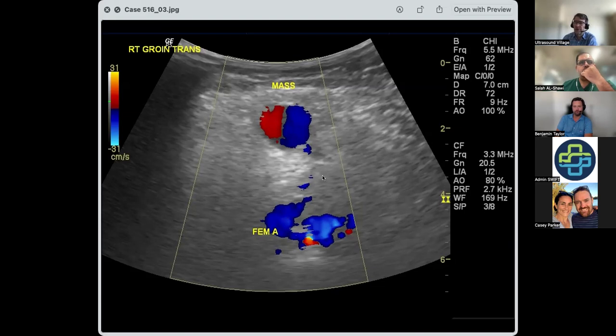So there's a number of treatment modalities. It is important to look at, think about and describe the neck, both in terms of the length and the width. With pseudoaneurysms, you absolutely need to know those comprehensively and be able to describe the signs that you're seeing. On grayscale, you say it's pulsatile. On colour, there's colour filling and a yin-yang sign, and on spectral Doppler, there's to-and-fro flow at the neck.